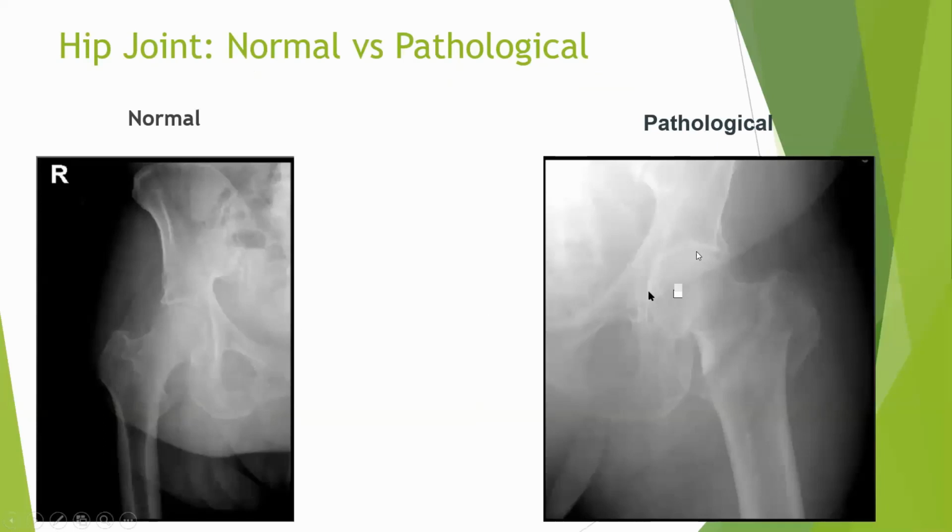You can actually see that the femoral head is jammed in the acetabulum. Look at the sclerotic plaques. Look at the head of the femoral head, which essentially has less blood supply and could lead to avascular necrosis. Possibly there is avascular necrosis, but it is hard to predict through an x-ray, and that's why it is extremely white in color or discolored completely. And there could be a fracture line I am seeing right over here.